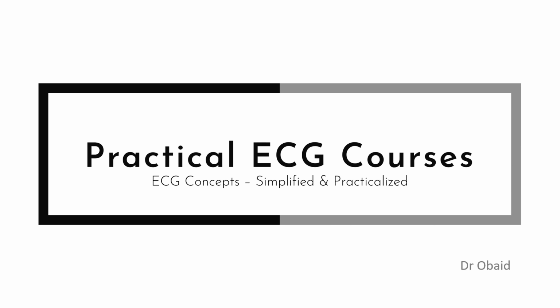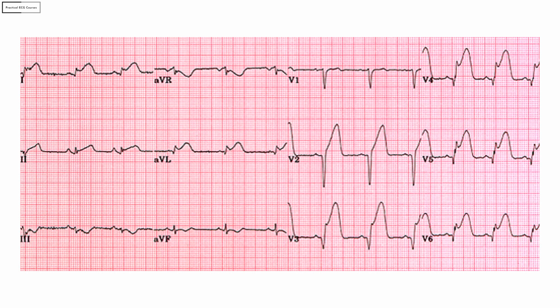In the ED, ECG interpretation is usually done by using pattern recognition. Let me show you an example. Take a look at this ECG. If you have had some experience with ECGs, you can immediately diagnose ECGs like this one. The moment you looked at it, you instantly knew that it was an anterior wall MI. You did not have to think about it. This is because you are familiar with the pattern.